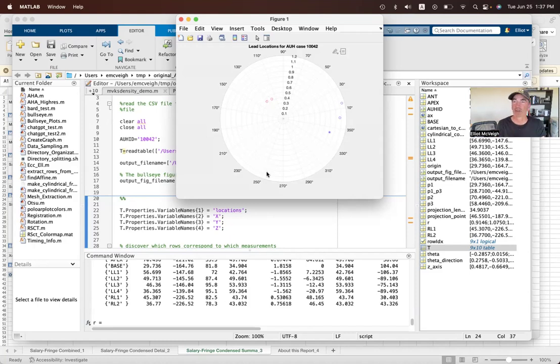But this is what we need in order to determine where the pacing is happening in this patient. So if the pacing is between lead 1 and lead 2, then this is the region of pacing right here. If it's between lead 1 and lead 3, then this whole thing, or it's between these 2 leads, etc.